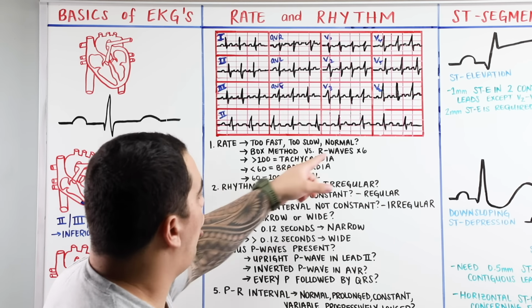All right, engineers, in this video, we're going to be talking about the ST segment and any particular abnormalities. Now, you guys may be wondering, Zach, why did we go straight from rate and rhythm right to the ST segment? Shouldn't we go through all the other parts of the EKG, like the different waves? You could, but here's the thing.